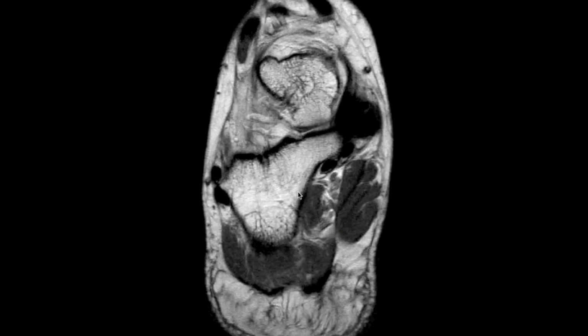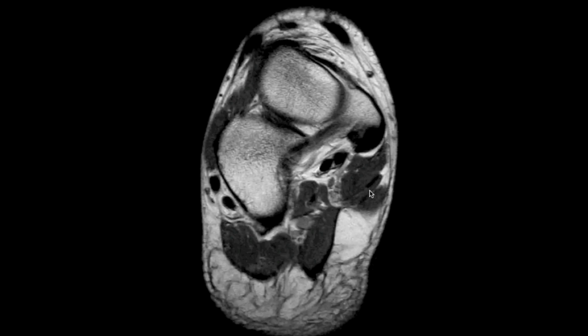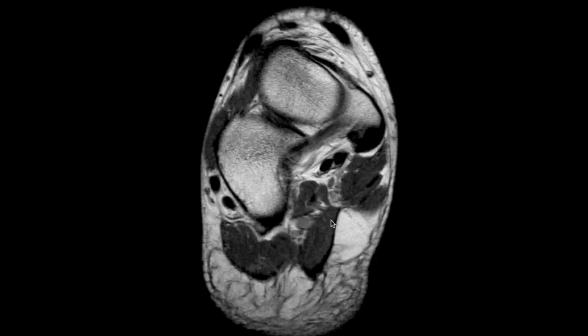Along the plantar aspect of the calcaneus, plantar medial aspect, we see the quadratus plantae muscle, which is one of the intrinsic muscles. And then the other three main intrinsic muscles of the foot at this level are intimately associated with the plantar fascia. So just deep to the medial cord of the plantar fascia is the abductor hallucis. Deep to the central cord of the plantar fascia is the flexor digitorum brevis, and deep to the lateral cord of the plantar fascia is the abductor digiti minimi, also known as the abductor digiti quinti. So abductor, not adductor, abductor.